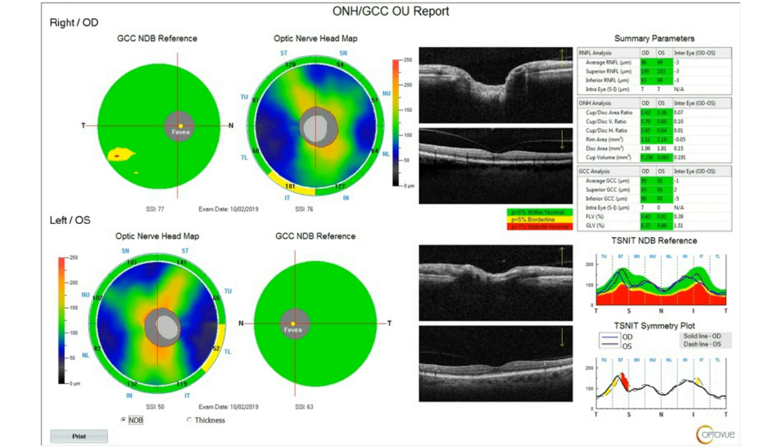We can also see the reflectance image of the nerve fiber layer start to break off as it gets close to that 101 reading. We also see a little blip in the ganglion cell complex on the left-hand side of our screen, whereas in the left eye, there is one area that's being flagged, the TL portion is being flagged at 52, but the ganglion cell complex looks great.